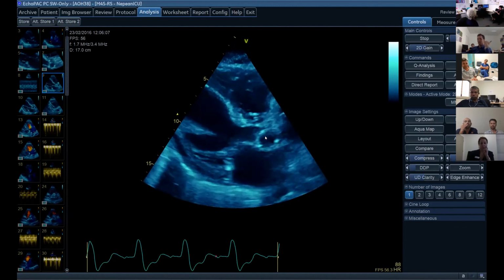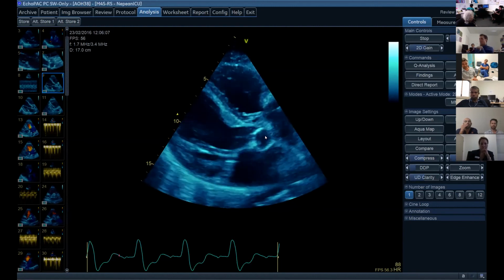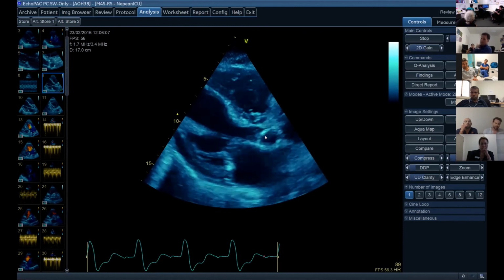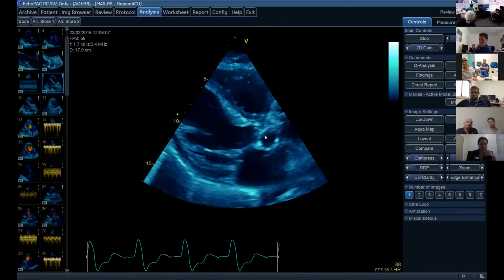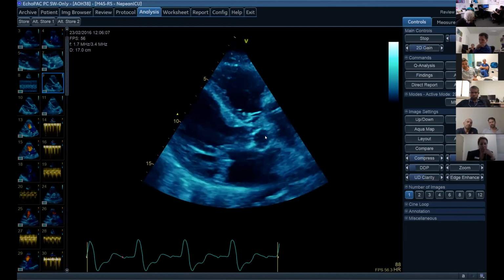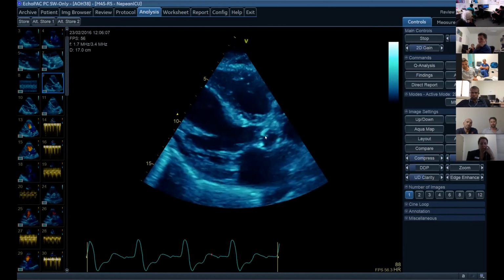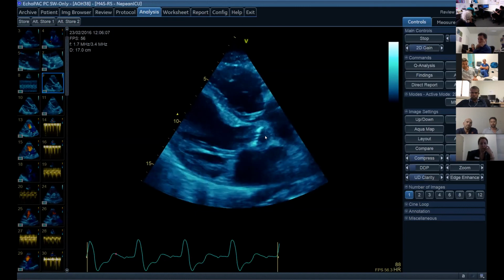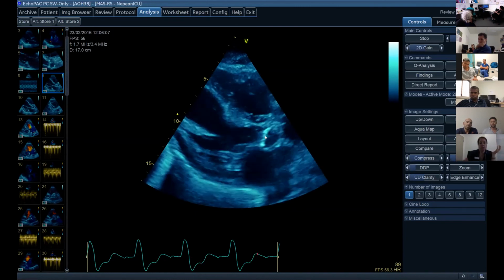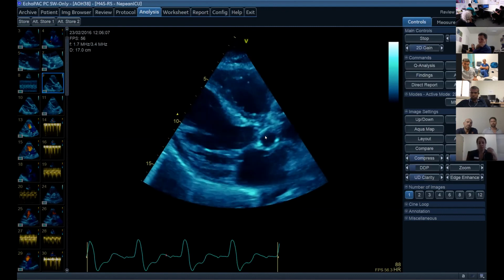I'd lean towards the idea that it might not be accurate there, but we do have debate about that. Isn't it that the LV cavity looks a bit dilated in this patient, and isn't it just the fact that the LVOT VTI is higher than what we would have expected, looking at that ventricle? But actually maybe the stroke volume is higher than what we would expect because even though the LV is contracting poorly, it's a bit dilated to begin with.